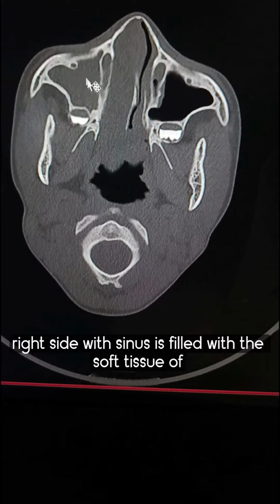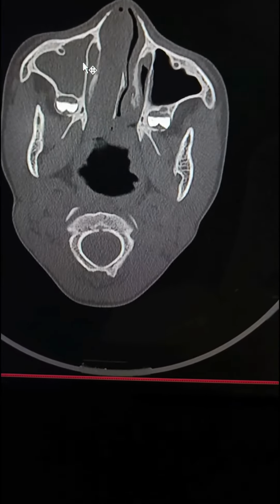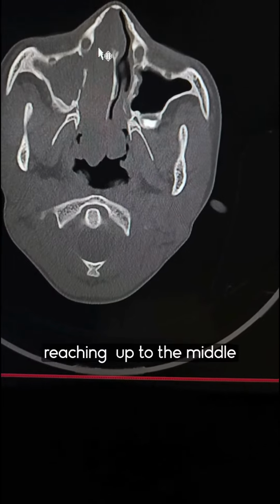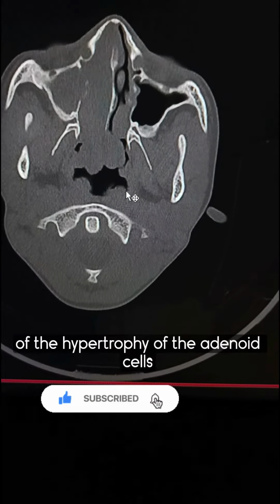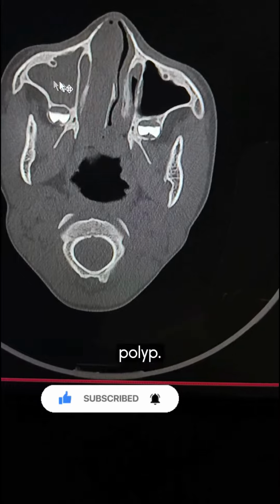Right side maxillary sinus is filled with soft tissue of HU 30. Also there is a soft tissue density noted in the right side ostiomeatal complex, which is reaching anteriorly up to the middle meatus and posteriorly up to the choana and nasopharynx. Also there is evidence of hypertrophy of the adenoid. So this is a case of antrochoanal polyp.